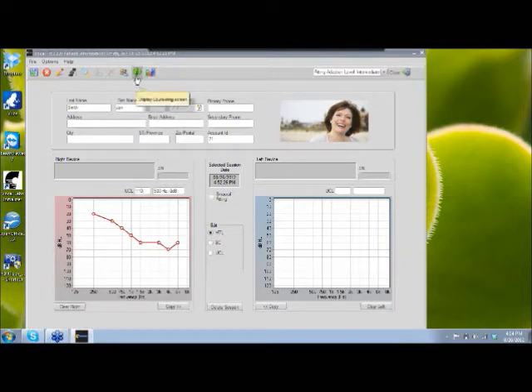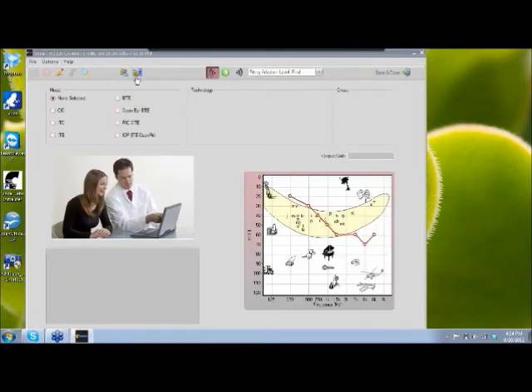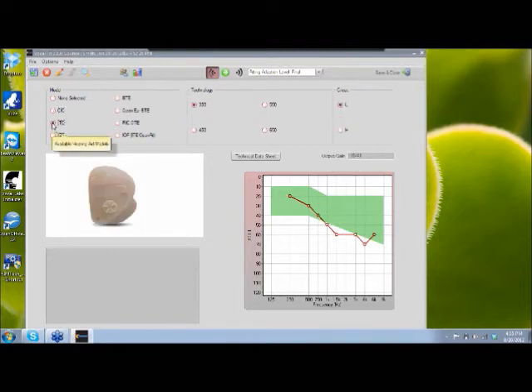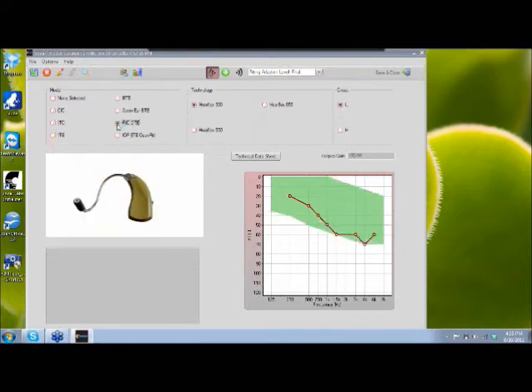I'm going to take us into the counseling screen because I do not have a product hooked up at this time. So I'm going to set up what product I want to simulate. But if you're not sure what product you want to fit on Vocal Labs, or if it's going to work for your patient, you can go to this counseling screen, and when you pick a product, you will see the fitting range over here on this side. So now obviously for this patient, a CIC does not look to be the recommended product. But you can cycle through other products and see what would work for this patient.